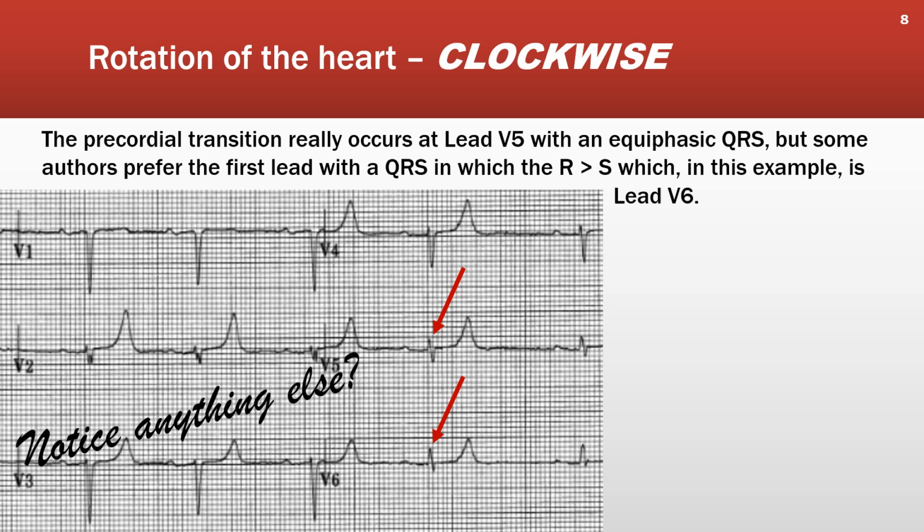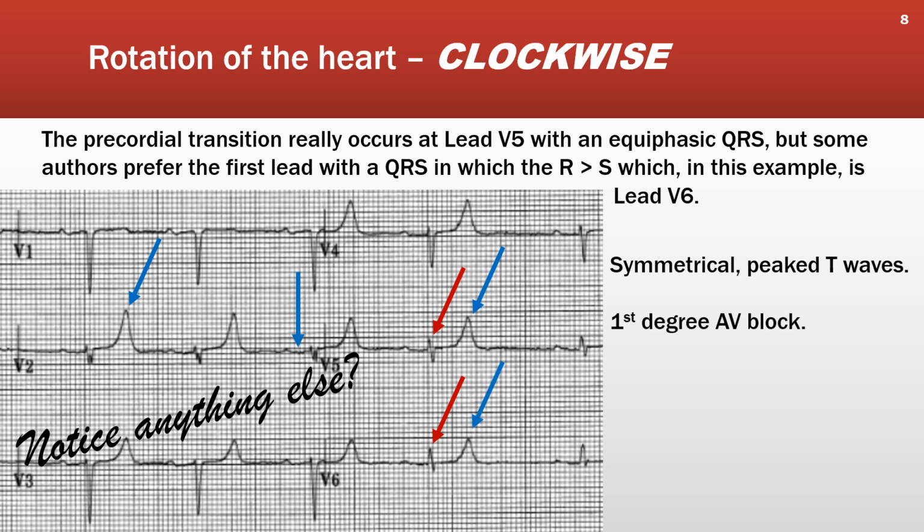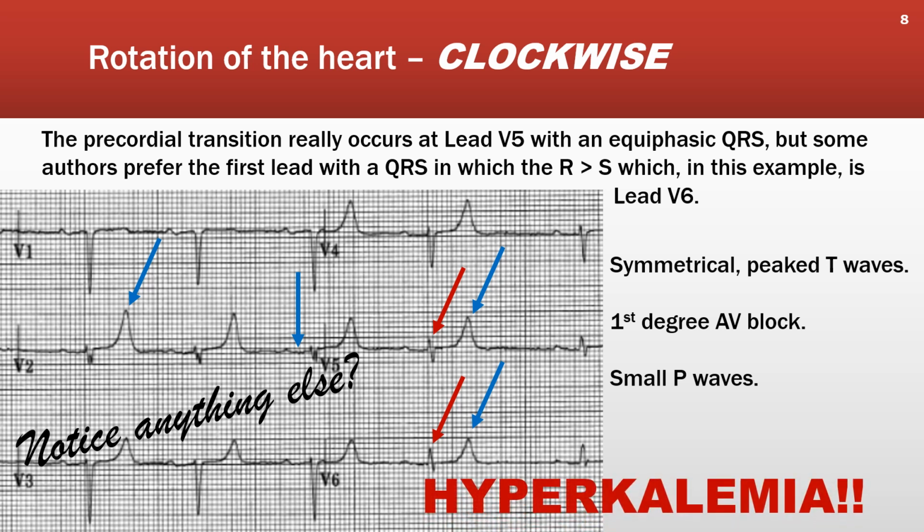Now, do you notice anything else? Sorry, but I just couldn't help pointing this out. We have symmetrical peaked T waves. We have a first degree AV block. And we have very, very small P waves. This all adds up to hyperkalemia.